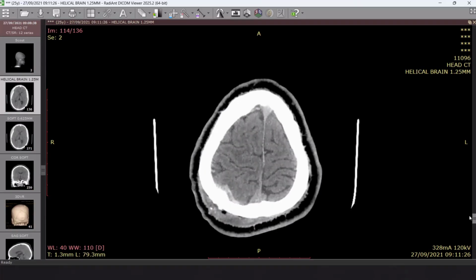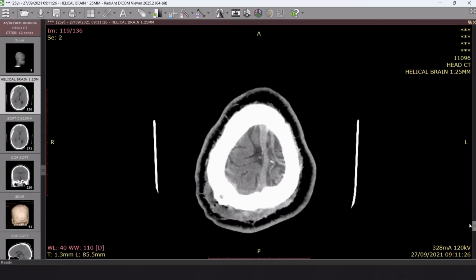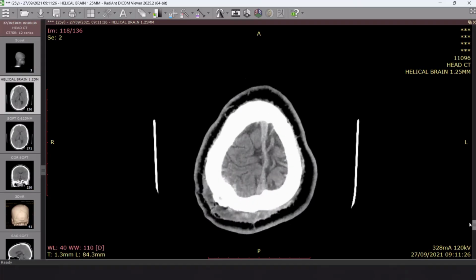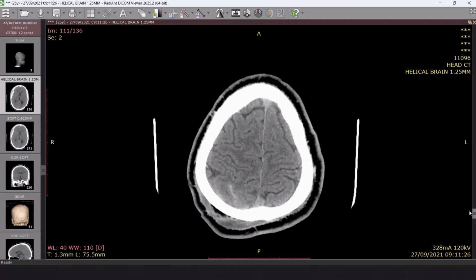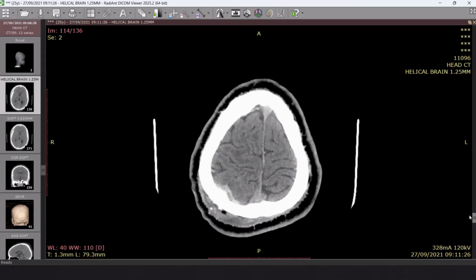And there is underlying extraaxial, I'm trying to check. Seems to be subdural hematoma. And CSF smearing. Yeah, you are right. We have smearing of the CSF at the right high parietal subarachnoid region. Yes, of the right high parietal, so the subarachnoid hemorrhage.